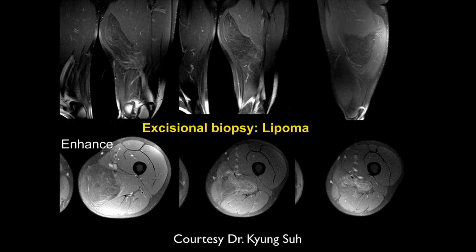Is there enhancement criteria at all? Yeah, if you have nodular enhancement or enhancing septa greater than 2 millimeters in thickness, then that has to be considered suspicious.